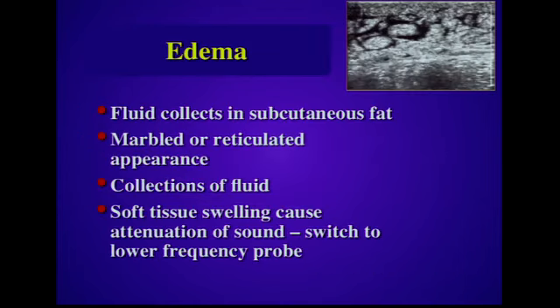When we see patients with soft tissue edema, we typically will see that fluid collects in the subcutaneous tissues. In this image, you can recognize a marbled or reticulated appearance. We see the anechoic fluid interspersed between the soft tissue. Sometimes you'll actually recognize collections of fluid in patients that have marked edema. With soft tissue swelling can come attenuation of sound. So if you have marked attenuation, you may want to consider switching from that high frequency linear array transducer to a lower frequency probe.